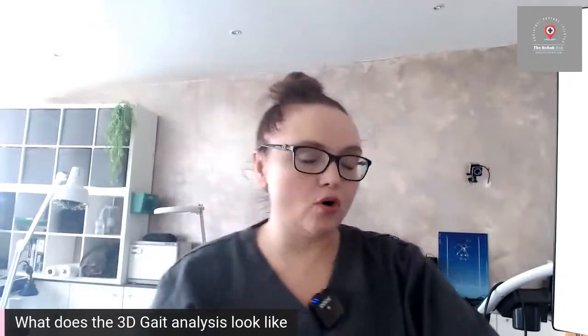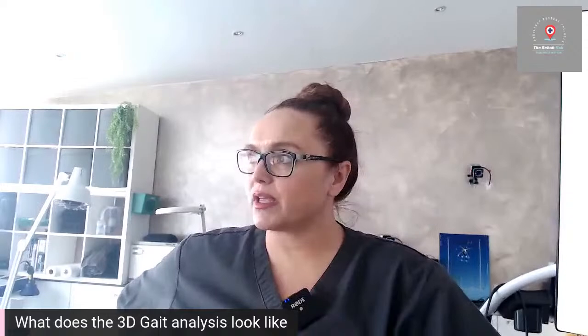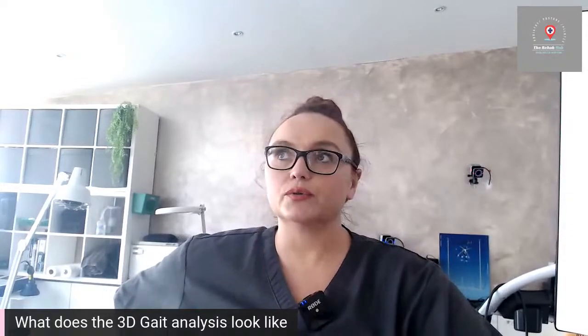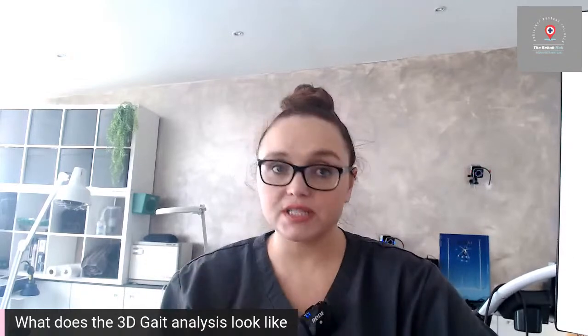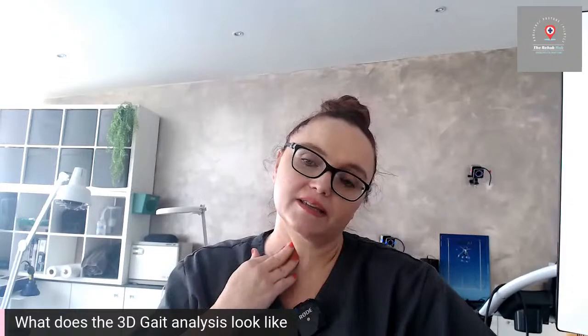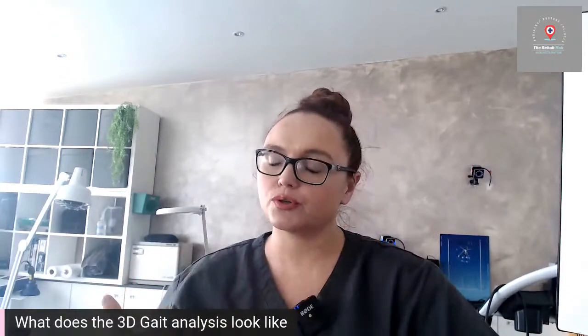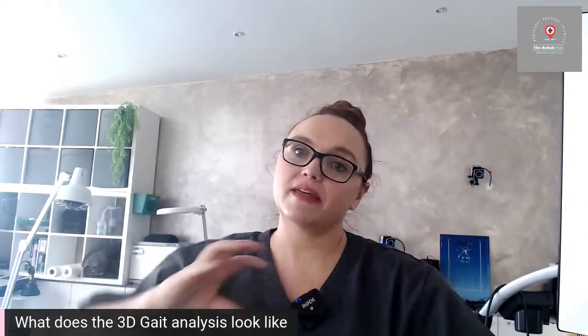That's quite common for a lot of healthcare professionals or other people working in health, where they'll download an app and it can slow motion down, so they'll be pausing the camera. The difficulty with those kind of things is that they're not accurate. You're unable to accurately analyse in 3 planes in that way.